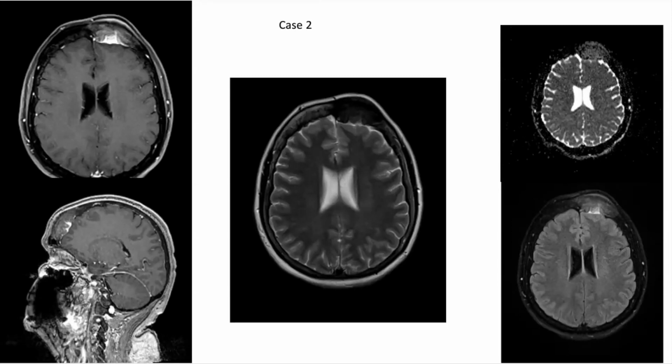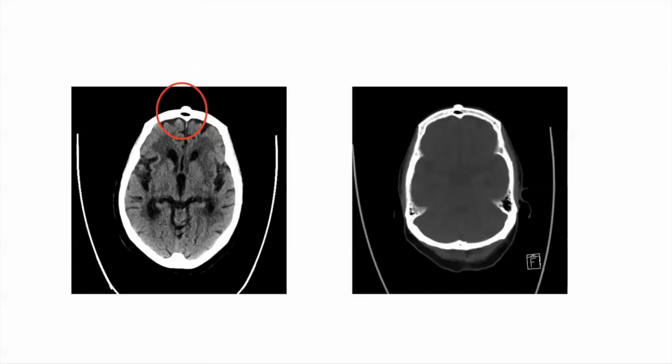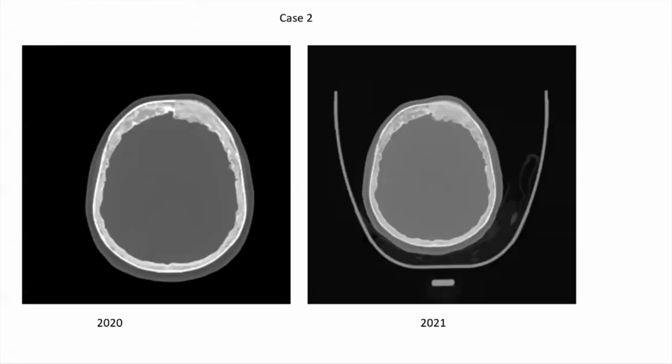The findings in this case, even though you probably have not seen one of these in your daily practice, is an intraosseous meningioma. And you just have to know that's how they look, because meningiomas, the way we usually think of them is an extraaxial soft tissue mass, occasionally intraventricular, but usually enhancing quite vigorously, where this doesn't seem to enhance that much because, again, you're really looking at sclerotic bone. So this was excised, and that's what the pathology was on this. So again, you want to consider that possibility of intraosseous meningioma.